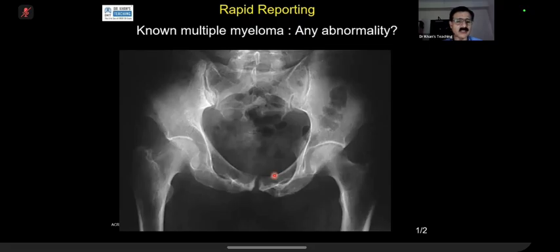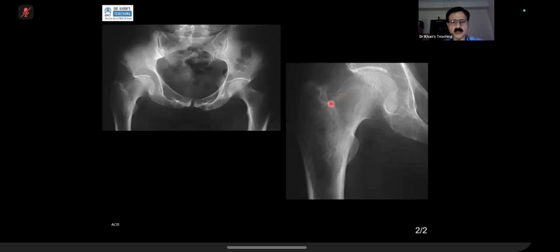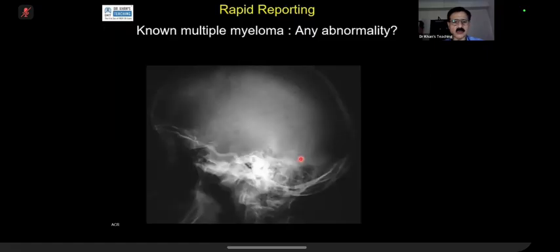Yeah, good. Well done. Somebody has picked up right proximal femur. This is a classical exam case. You can see these trabeculae, which are normal, and then there is a lucency here. Look, compare it with this. So in the pelvis compared, well done. And this is a sort of a close-up of the same thing, and you can see that this is what it was about.